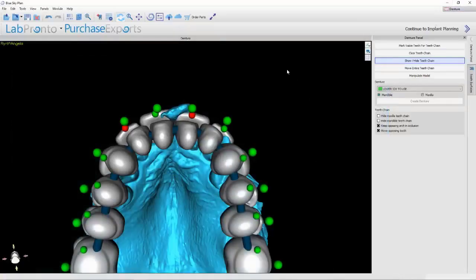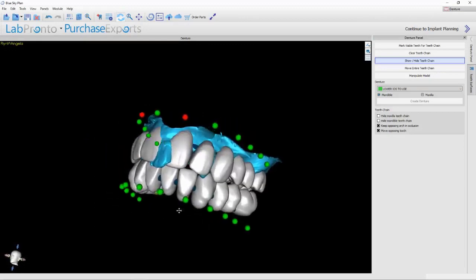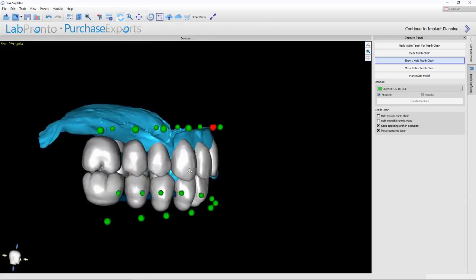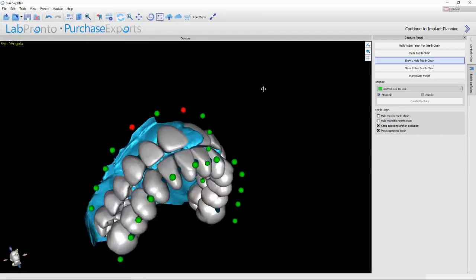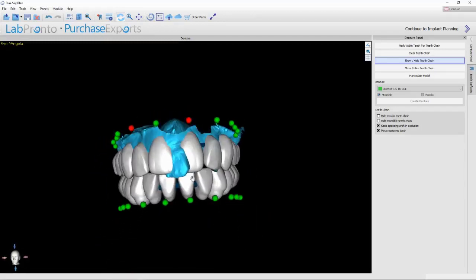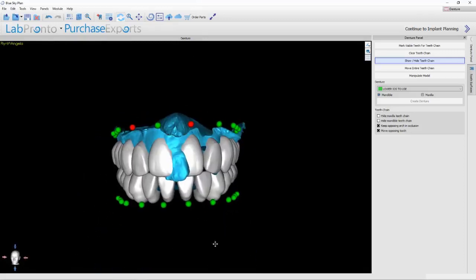Alright, so anyway, this is basically it. And since I covered digital dentures, I think several weeks in a row, I'm not going to just go through and design the digital denture, but essentially all I'd have to do is now cut the teeth off of her maxillary cast, re-import that, and then make the denture on that cast, but with this tooth set up.